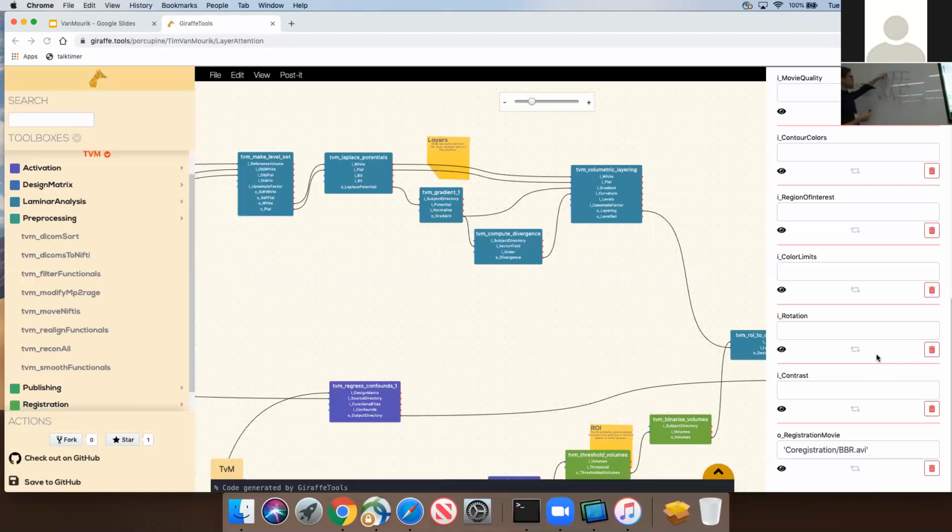But those voxels also lie in different layers. So ideally, you wouldn't necessarily interpolate. Instead, you would like to separate the layer signal. Now, is there a way of doing that? Well, there is.